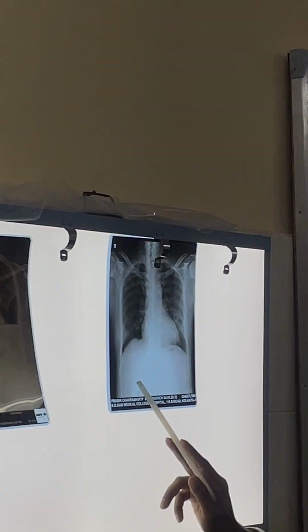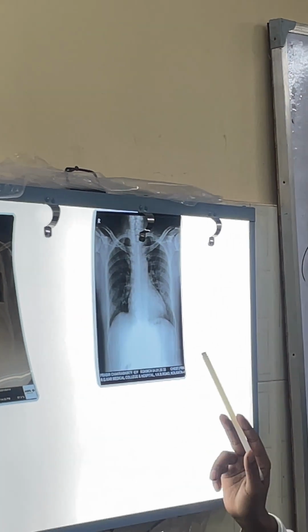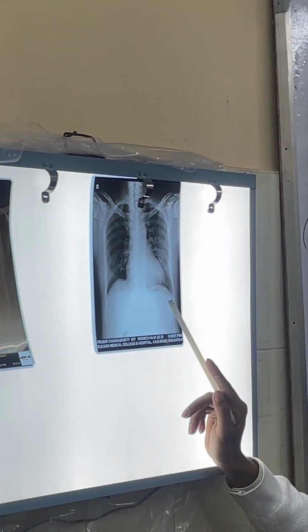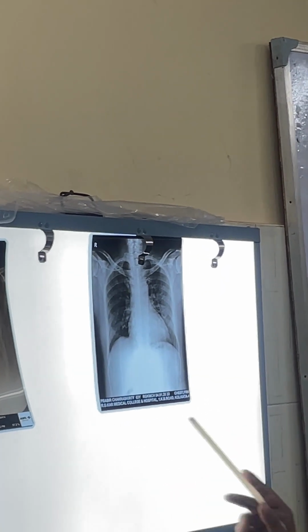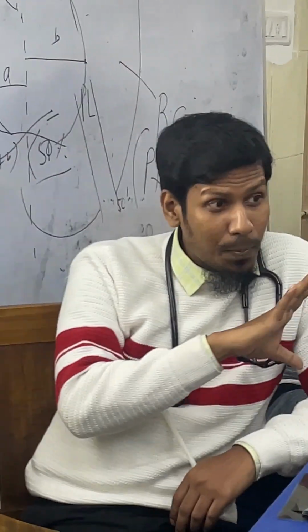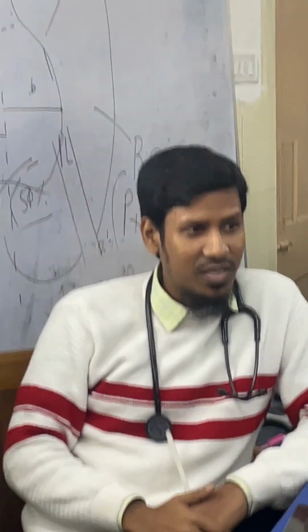But in this picture, if you see all the intestine at a time, there is no air. In the fundus area there is no air. In the liver area, the entire part is radio opaque, so that means there might be ascites, as it is homogeneous throughout the abdomen.